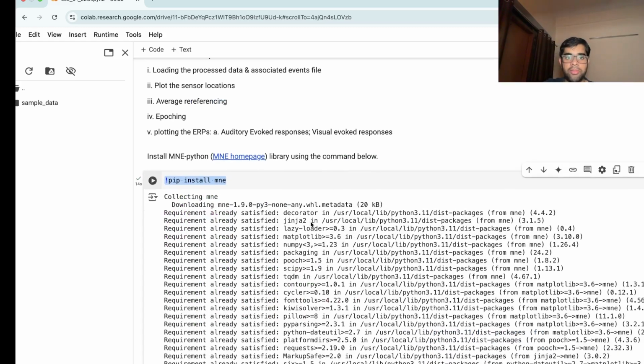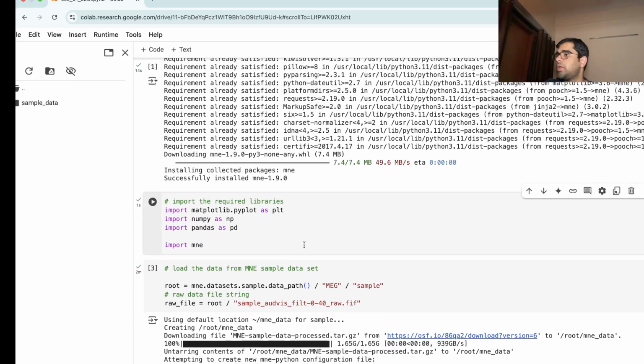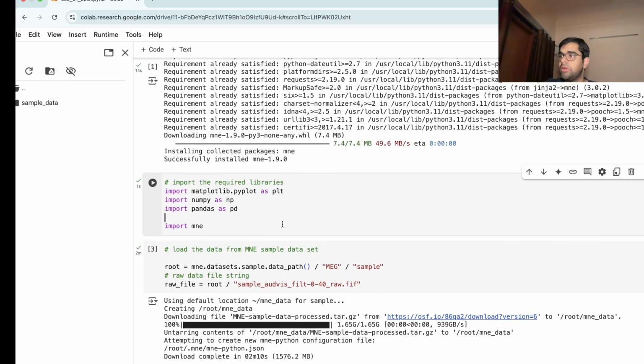Okay, I hope it's clear. For those not familiar, libraries are just a set of packages and programs written in Python, so that you can directly use their functions using object oriented calling. We'll get it clear as we go on, but you don't have to worry right now.